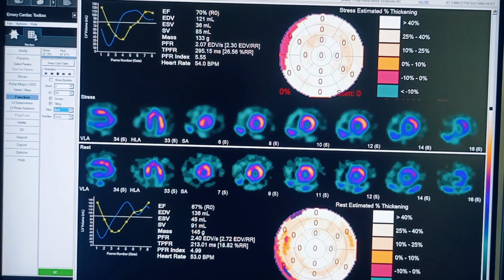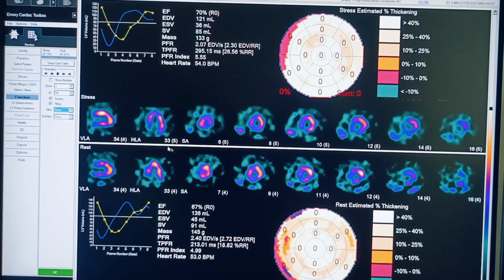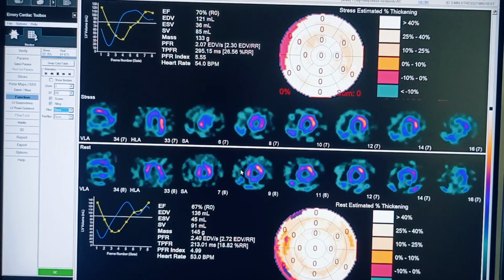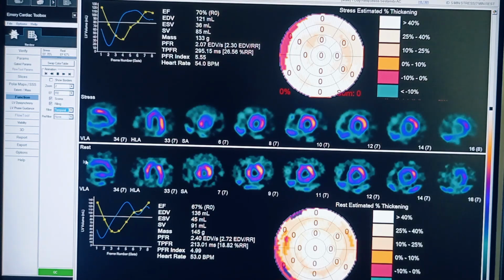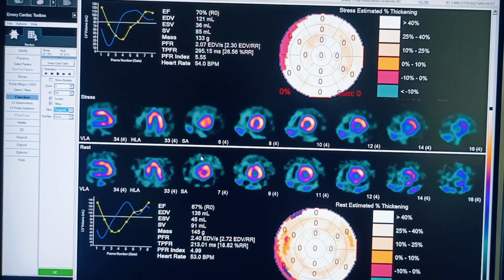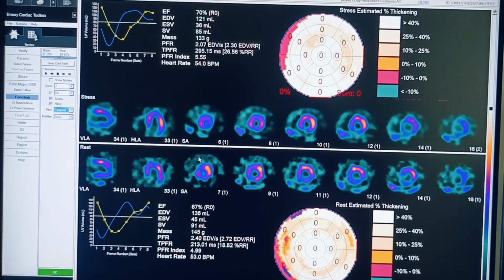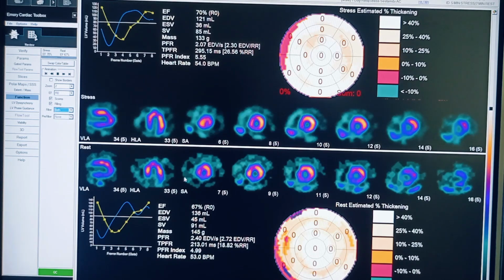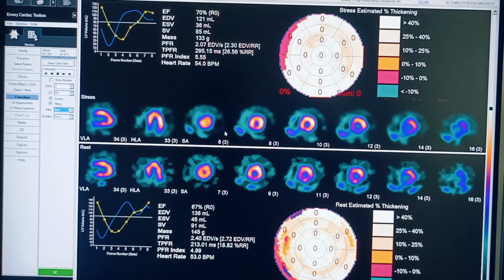Filter में there are two options. If you click none, you can see image becomes little noisy and the movement is not that good, right? So there are two ways. One, temporal. If you select temporal filtering, you can see there is a rhythmic movement, and spatial also. If you select both, you can see there is a proper visualization of the movement.